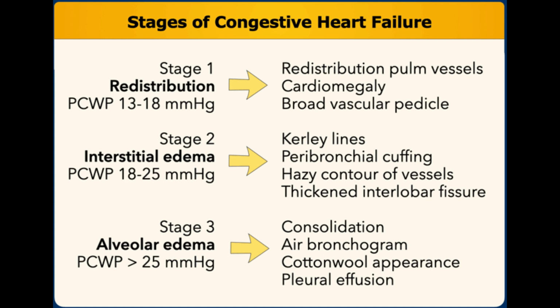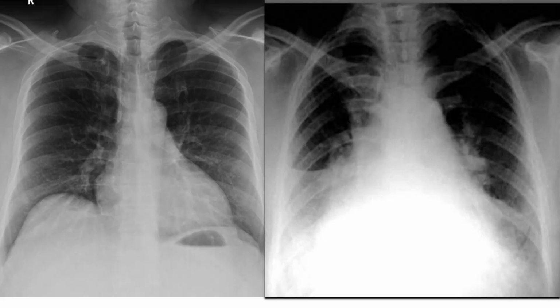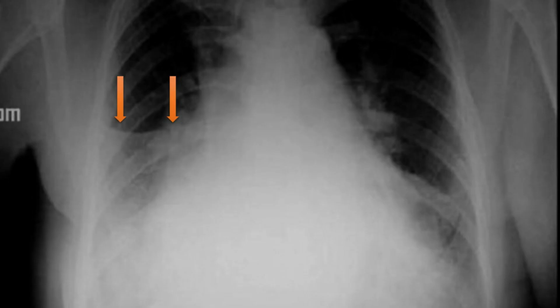After a week she consulted our cardiologist again, and at that time an X-ray chest PA view was done, and the cardiologist saw the same meniscus sign in the X-ray chest and sent for ultrasound chest to rule out pleural effusion. He had also mentioned the meniscus and asked us to interpret with ultrasound, and ultrasound was done and there was no pleural effusion. And I can see the X-ray chest was almost like that, the meniscus sign was there. Is it due to any artifact? Our question was whether we need a CT chest or a repeat X-ray chest.